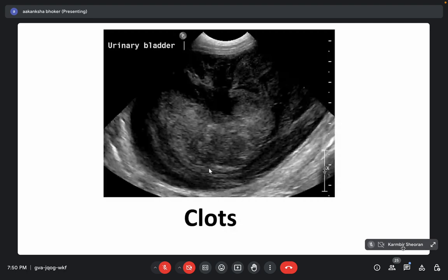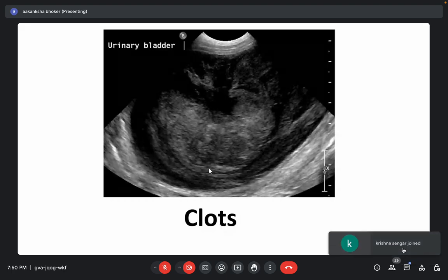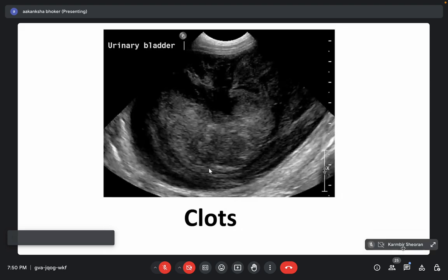The vascularization can be less or more. You can simply correlate with any surgeries you are performing. Some surgeries are very easily done, taking a mammary tumor, for example, with one major blood supply, we simply ligate and easily remove. At times there is so much angiogenesis, there are multiple supplies and we have to ligate each and every vessel. So the vascularization level differs accordingly.